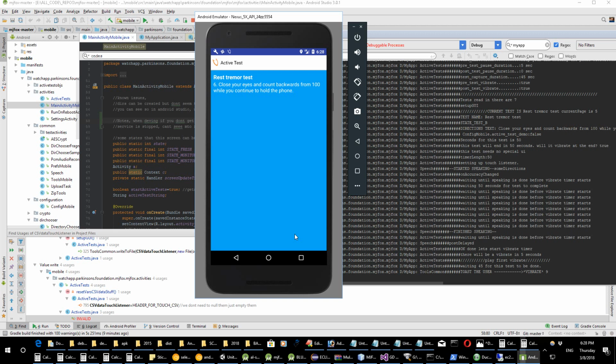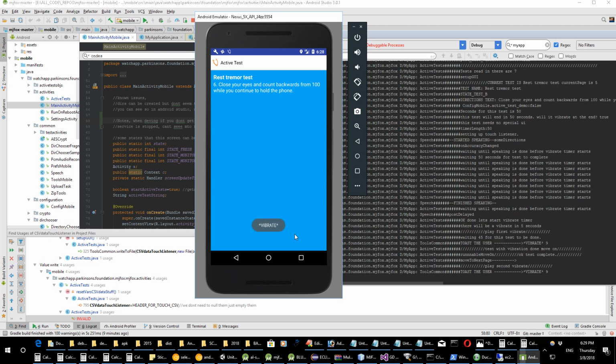And all of these tests that you see here, and all of the timing and the vibrations and that, they're all specified using JSON files, so they can be highly customized after the event. Once the app is already written and they don't need me, they can go, oh, actually we want to revise this test and we want to change that, without the programmer. That's the idea. This one, some of them go along. There you go. That's the end of that one.